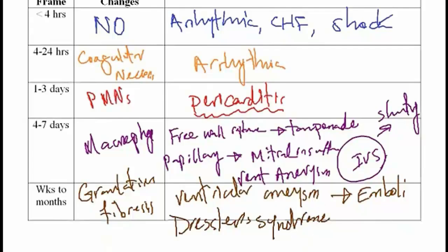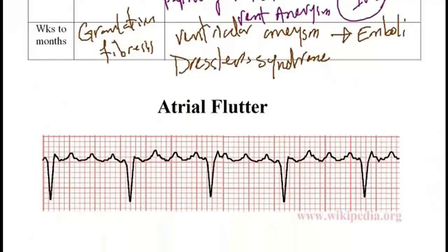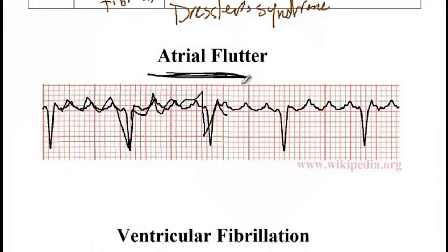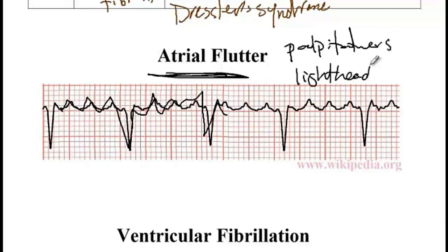Alright, now next I would like to discuss a few other EKG abnormalities. So with the atrial flutter, it has a sawtooth presentation. So here you can see it's like a sawtooth presentation. And then these patients have similar symptoms to those that have atrial fibrillation, which includes, for instance, palpitations, lightheadedness, as well as the shortness of breath.